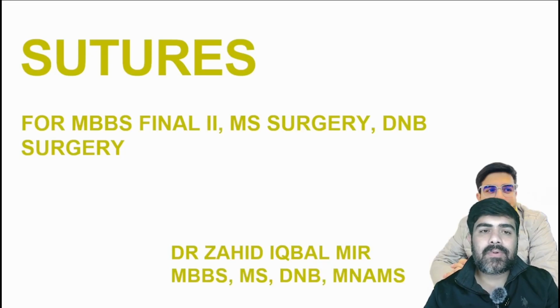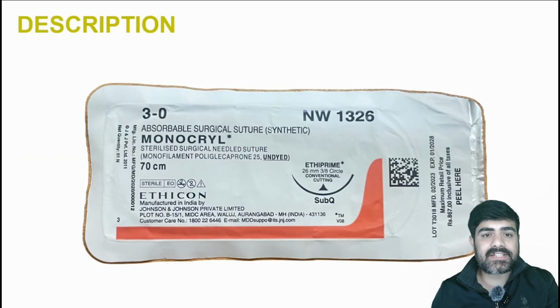Hello everyone, today we will be discussing sutures. So, for MBBS final part 2, MS surgery, DNB surgery practical examinations, this is the description of the suture.